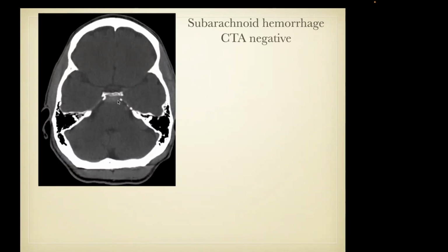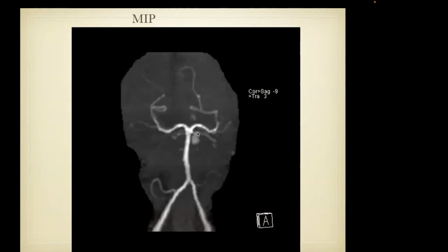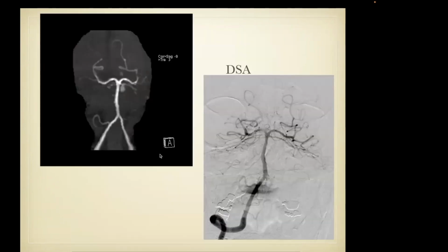This is a patient with subarachnoid blood who had a negative CTA and had an MR scan a day later. This is the MRA. Here we see the flow-related enhancement in the carotid arteries. And then there was this thing that looked like it was hanging off of the basilar artery. This was the reconstruction, which looks exactly like a saccular aneurysm off of the superior cerebellar artery. Again, basilar, vertebral, PICA, posterior cerebral arteries here. The patient went to angiogram for presumed treatment of this saccular aneurysm. This was the digital subtraction angiogram: gone.